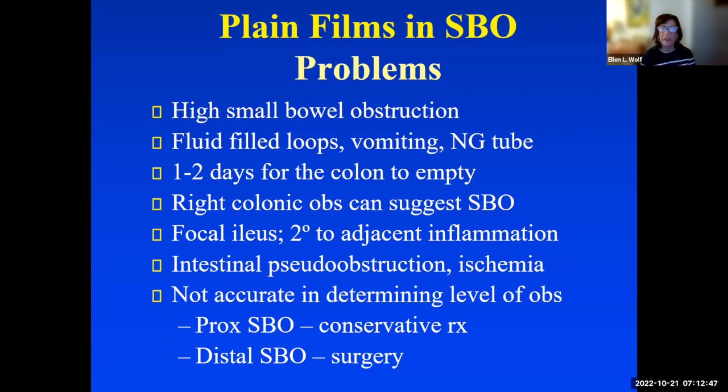So plain films and small bowel obstruction, there are problems with the diagnosis. If there's a high small bowel obstruction, the obstruction is high in the small bowel, we're not going to see a lot of dilated air or fluid-filled loops of bowel because the obstruction is too high. We're not going to see those classic findings.